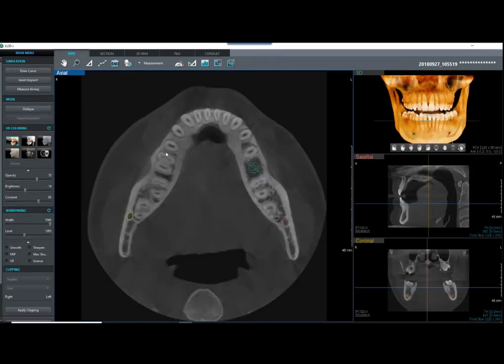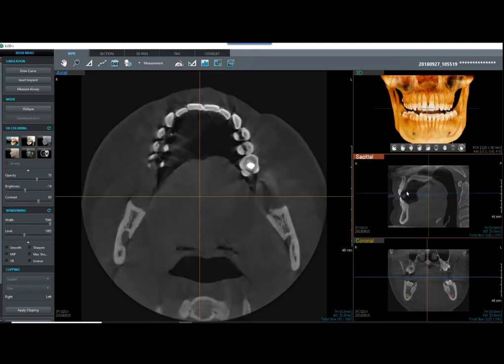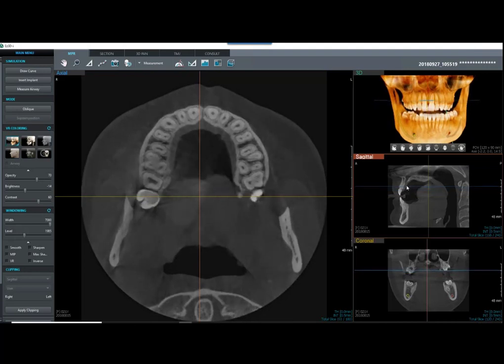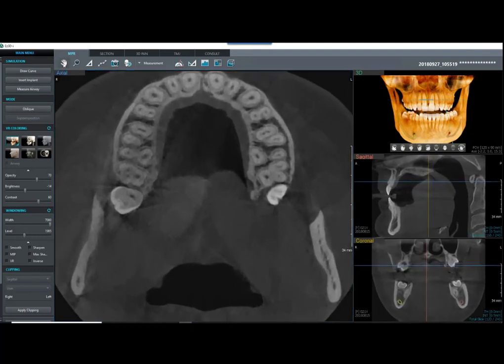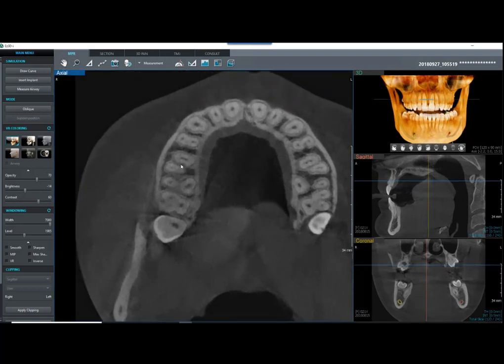Let's go back to our MPR window, and I'm going to go ahead and scroll. Let's grab up into the maxilla. Maybe we've done implants, a quick overview. We've looked at extractions. Now let's go ahead and look at some endo here. As we were doing our overall analysis of our image, we noticed tooth number 3, our first molar here, might have a fourth canal. So I'm going to use control and the wheel on my mouse to enlarge that. And I'm going to come up here and use my hand to pan over to our site here. Let's focus right in this area.